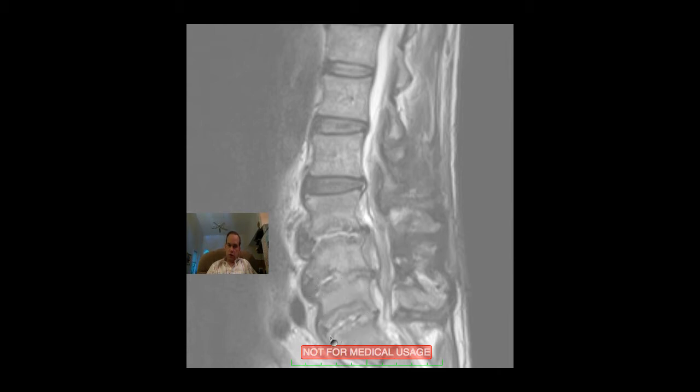So all of this I would group together as degenerative disc disease, severe.